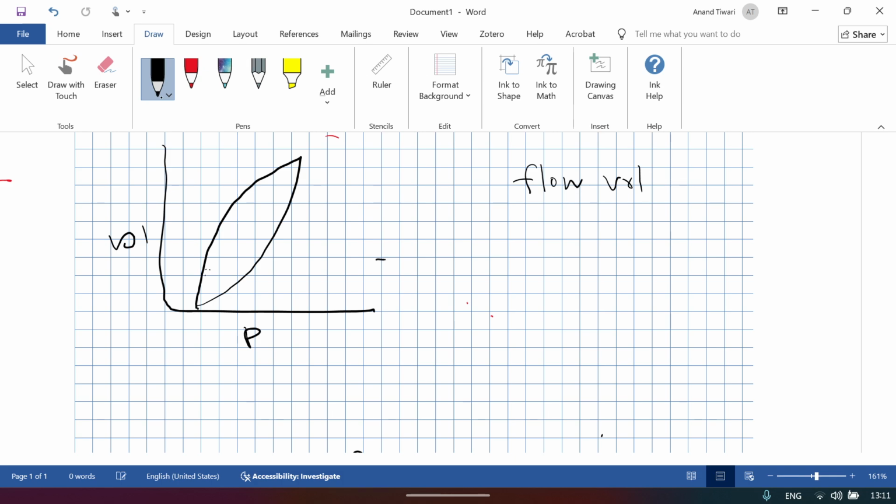Now over certain days of time, this loop has turned toward the baseline. So more pressure is required for inspiration and then coming to expiration. So this loop is shifted downward. That means the compliance has gone down, so the lung compliance has become poor. That is the idea you can get from the pressure-volume loop.